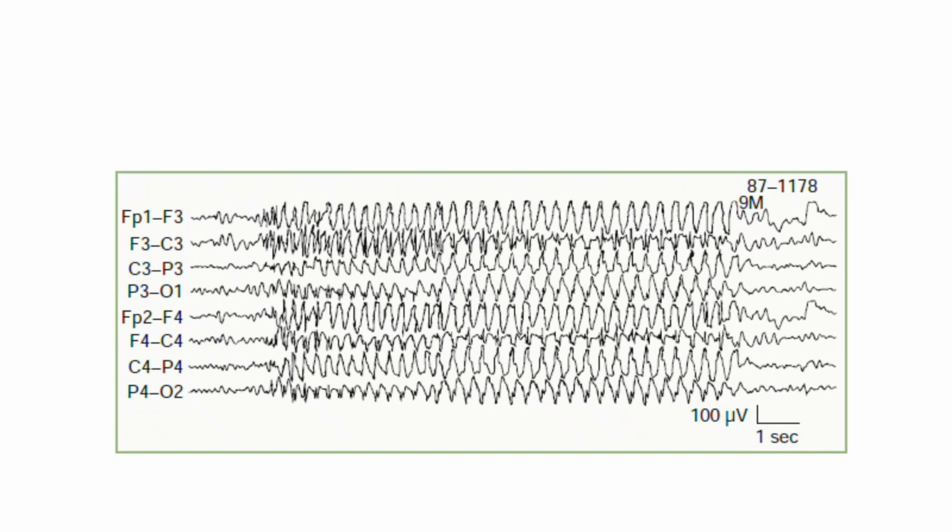The ictal presentation. The caption notes that the specific discharge lasted 12 seconds, during which the 9-year-old boy was unresponsive and demonstrated rhythmic eye blinking. A burst lasting less than 2 to 3 seconds is often subclinical. The patient may not notice it.